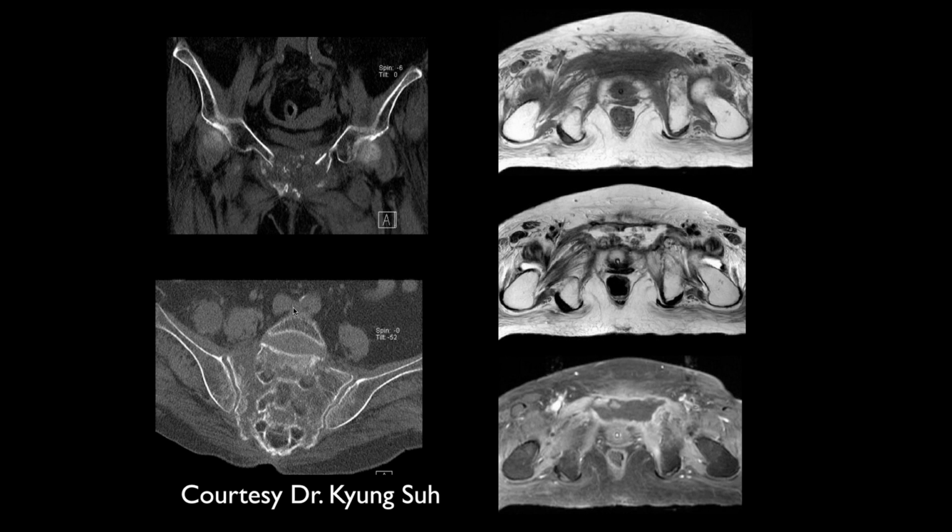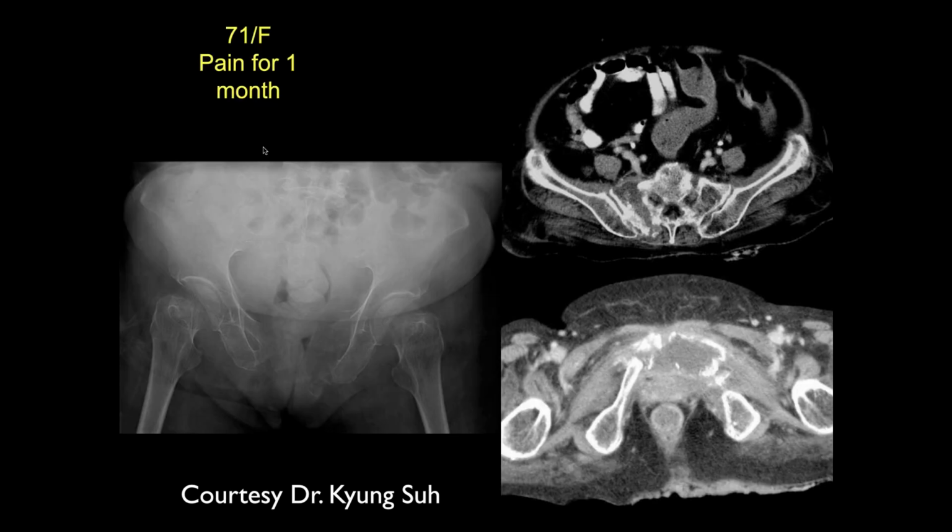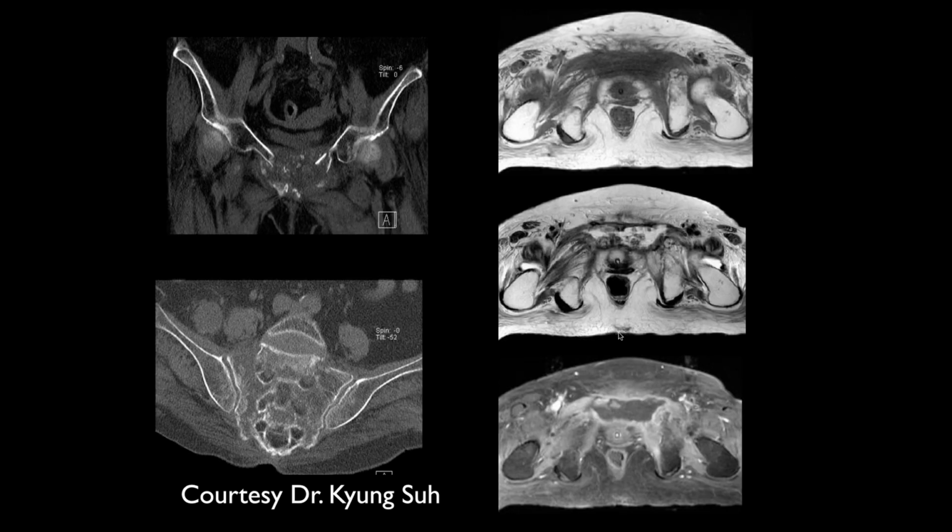I mean, that's severe osteoporosis. That's severe osteoporosis. Look at the hips. Where are we going to, like on the plain film? The prior film right there. Yeah, look at the hips. So they look normal. Well, here you can see the cortices look very dense. That's really because you lost a lot of trabecular bone due to the osteoporosis, right? And is there just osteoporotic fractures? Is that what you're calling this?